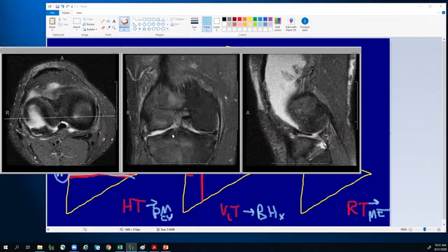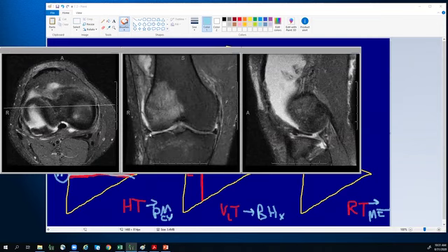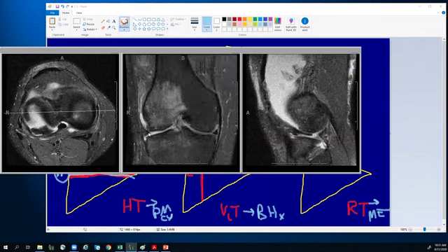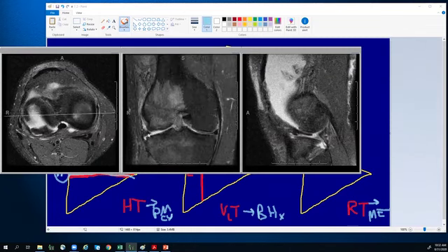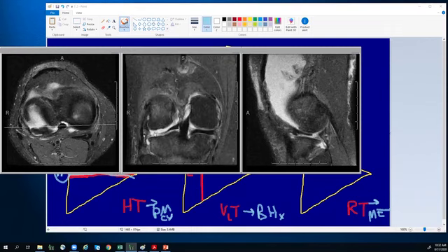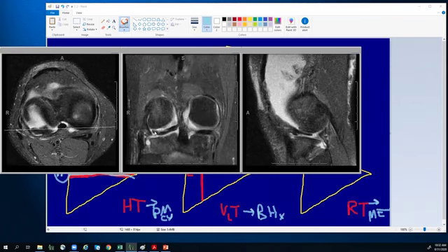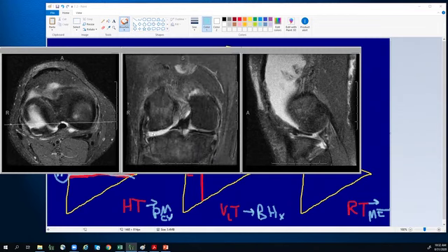But I would like to point out that, again, we're looking at the medial meniscus. Here's the anterior root attachment. I'm entering the anterior horn, then I'm entering the body of the medial meniscus. And then as I go further posterior, the meniscus starts to lose volume, and then eventually it disappears completely for a few slices. And then when I go to the proper slice, it reemerges, and I could see the posterior root attachment. But there's several coronal slices where the meniscus basically disappears.